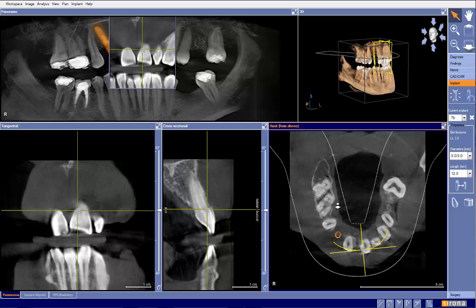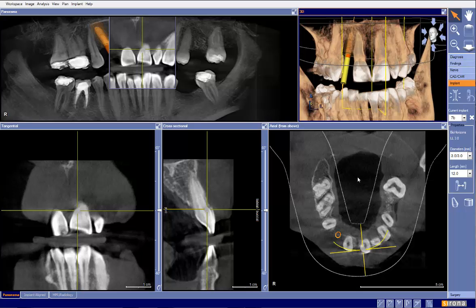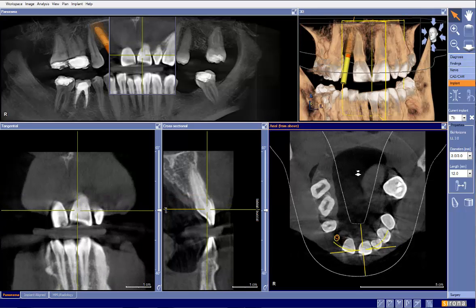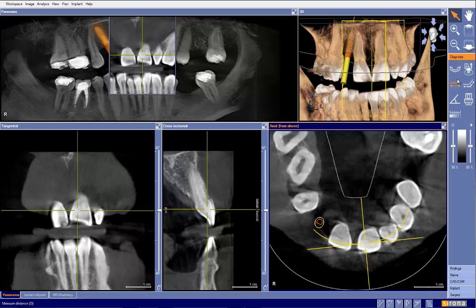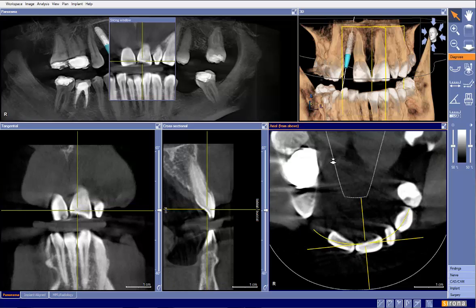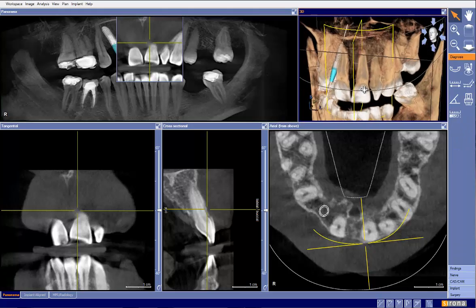Now, in looking at the site, one of my concerns, beyond the implant planning part of it, is the amount of space that we have here. If we were to simply put a single implant here, we would have a tooth that would be approximately 9.5 millimeters wide, which would be actually wider than the central incisor that we have there. So aesthetically, I begin to get concerned about this particular site. Again, will the implant support it? That's another question that we can answer.